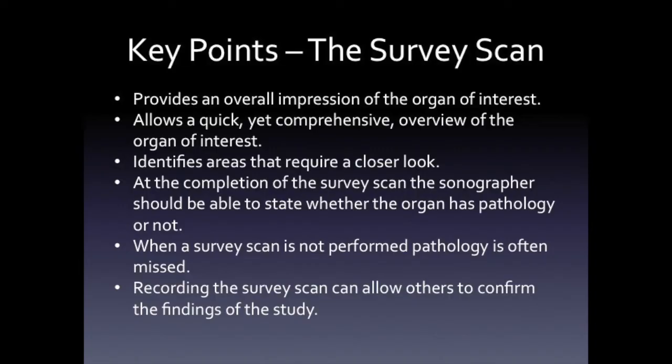Oftentimes, when a survey scan is not performed, pathology is missed. Recording the survey scan can also allow others that may not have been present during the live scan to confirm the findings of the sonographer who performed the study.